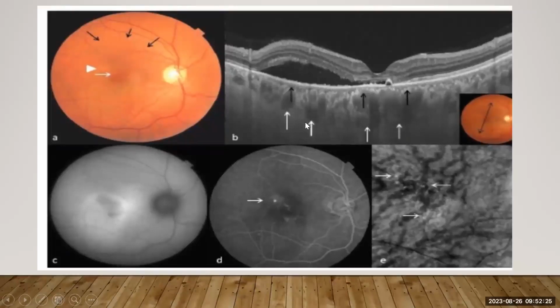So the large choroidal vessels here are dilated. They are big. See the hollow. So this is part of a pachychoroidal disease. Pachy means thickened. It's thickened because the vascular layer is dilated.